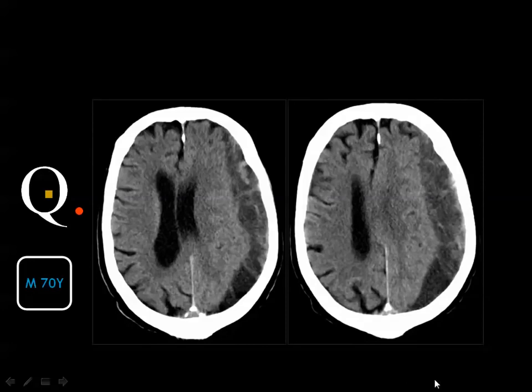Axial CT scan of the brain without intravenous contrast injection showing a large extraaxial subdural, mainly hypodense collection with some internal hyperdensities, seen overlying the surface of the left cerebral hemisphere, associated with significant mass effect in the form of effacement of the cortical sulci, compression of the left lateral ventricle, and contralateral shift of the midline structures.